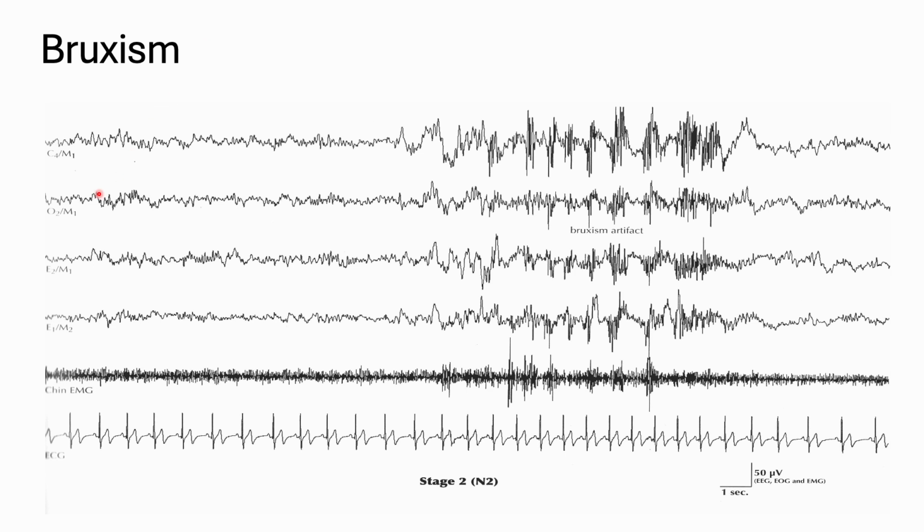All right, it looks like we're in non-REM here. The top two, maybe a spindle there, and then a K complex with an arousal. So we would not count that K complex towards N2. And then we have these rhythmic bursts. And you see those little tiny sharps? Those are muscle cells. And then you got a lot of them together, and they make these black blobs. Remember, muscles activate very quickly, so they will appear like waves very tightly together. These aren't brain waves, because you can see the muscle activation show up in the chin EMG down here.